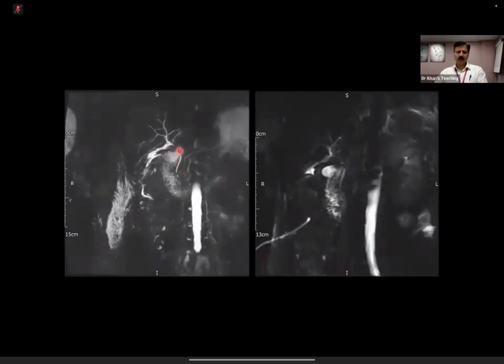You can see that part of the common hepatic duct level is not visible, but that might be because of edema, etc. There was a lot of fluid coming out, and there was a bit of bile there also on lab analysis. They knew that something is there. They put this drain there, and then after a while they wanted to make sure that there is no further leakage. For some reasons, they could not do an ERCP, and at that point, a nuclear scan was also not available.